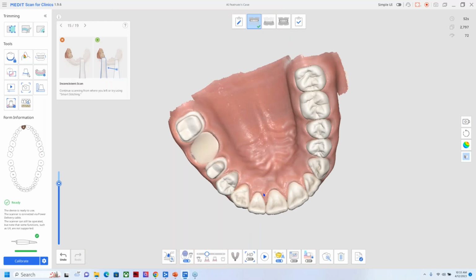So Smart Scan Guide is like a navigator. It's always running in the background. This feature actually shows alerts on the screen. It just basically notifies the end user what needs to happen in order to continue scanning and pick up reliable data. Again, as shown, it's just going to notify the end user. This feature also alerts users when the data is overly filtered out due to choosing the incorrect scan option at the bottom of the screen, the filter down here at the bottom.